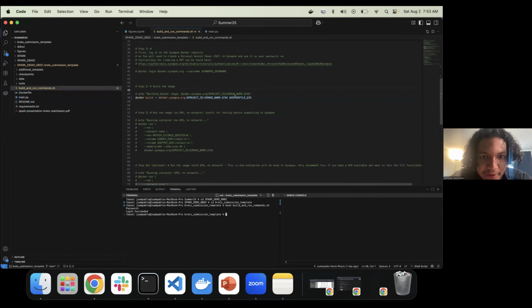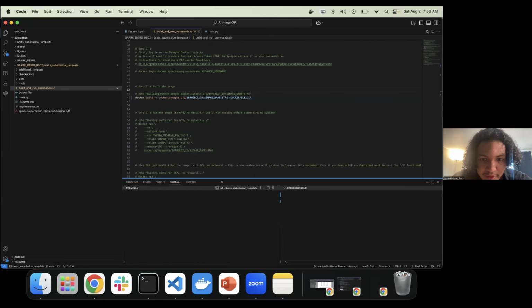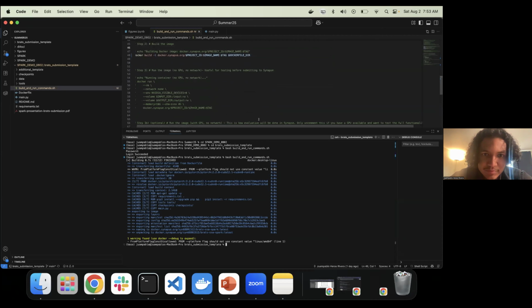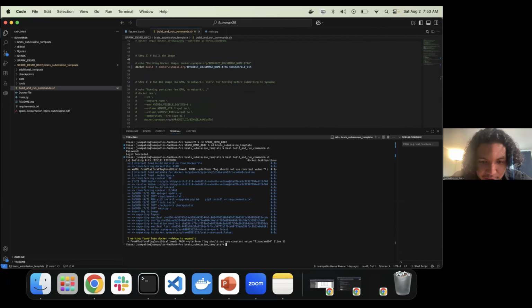So once I have uncommented this, I can run Docker build, and this will run the build commands as I said previously. So it'll build, and when it successfully built the image, you'll see this command here, building the time and then built finished. So if not, you'll have some errors. Yeah. Does somebody want to have a question? Sorry. Oh, okay. And then, once our image is built, we can see it with Docker image ls.